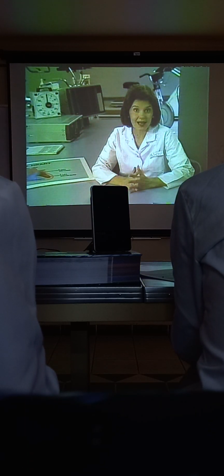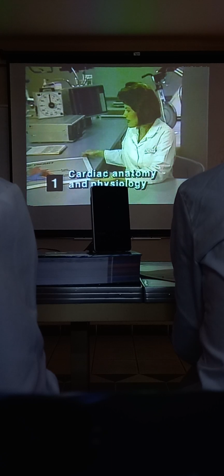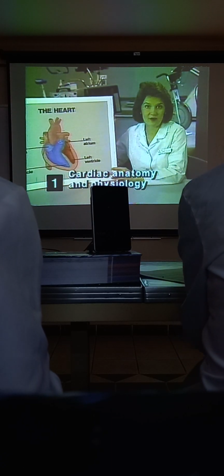Phone lines can be used to monitor a patient's EKG at home. And remote capabilities permit monitoring patients in outlying hospitals, clinics, and nursing homes. So the opportunity to evaluate an EKG is likely to be encountered in all areas of nursing. And like any technical skill, practice, combined with an understanding of physiologic principles, is essential to your competent performance. Let's get started by reviewing the anatomy of the heart.